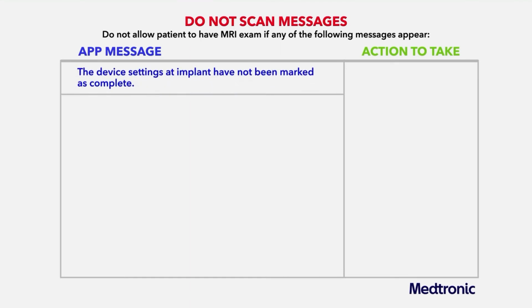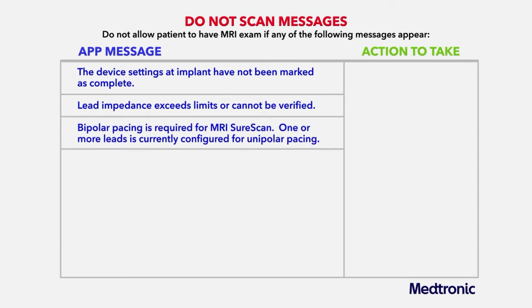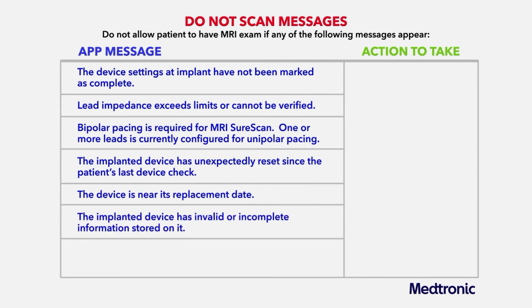The device settings at implant have not been marked as complete. Lead impedance exceeds limits or cannot be verified. One or more leads are currently configured for unipolar pacing. The implanted device has unexpectedly reset since the patient's last device check. The device is near replacement date. The device has invalid or incomplete information stored on it.